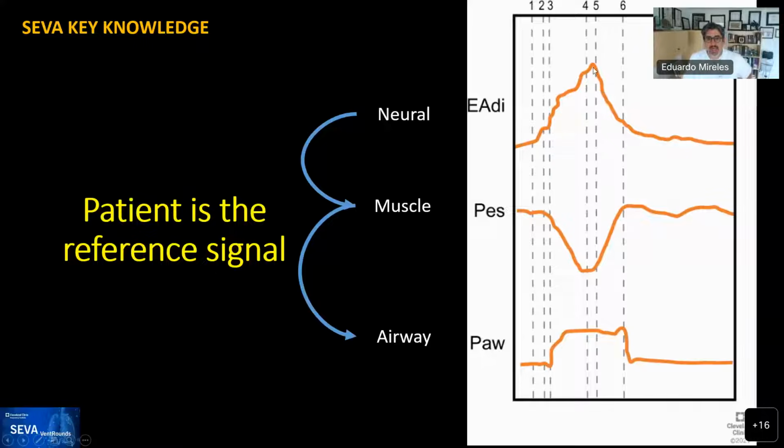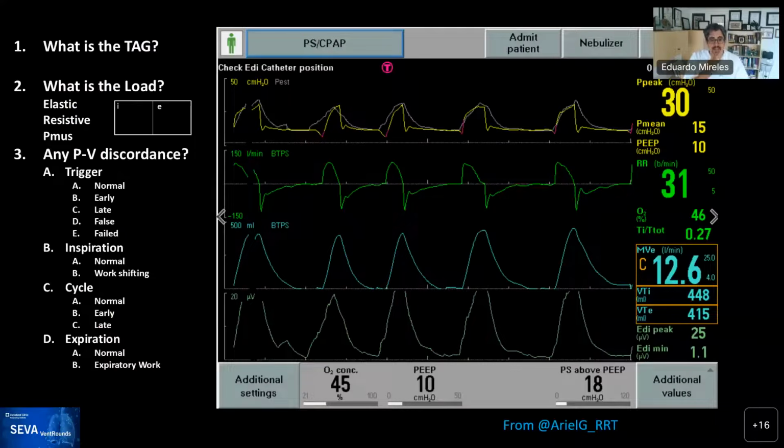So give it a try and start putting in the chat. What I would recommend is that you put first the tag, then just press enter and send it, then enter your load, enter, and then just keep going at it without fear. I'm going to give you a minute or so to read this waveform. Okay, tags are starting to come in.